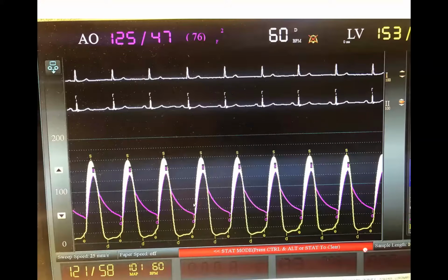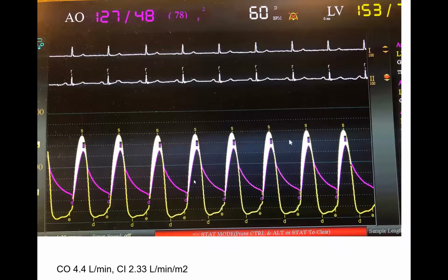Another thing that can happen, one chamber can have more damping than the other chamber. Imagine that the aorta is very damped, that aorta tracing will go down. That will create a false gradient. So you want to ensure both chambers are properly damped, certainly not too damped. So you have to ensure proper damping of both chambers. And one thing to do, if you have a not so good damping of one chamber, then when you swap, you will realize your error. So it's always important to swap both transducers and ensure you get the proper gradient.